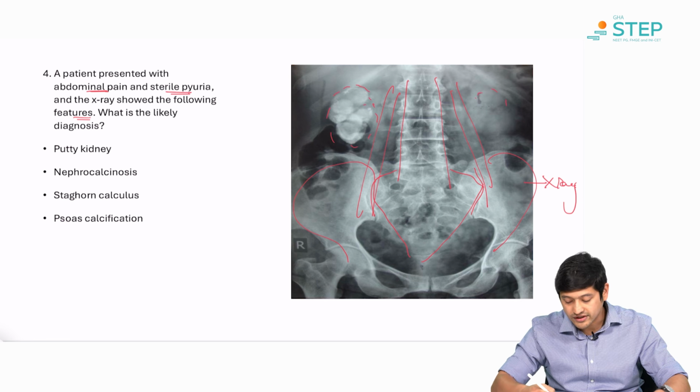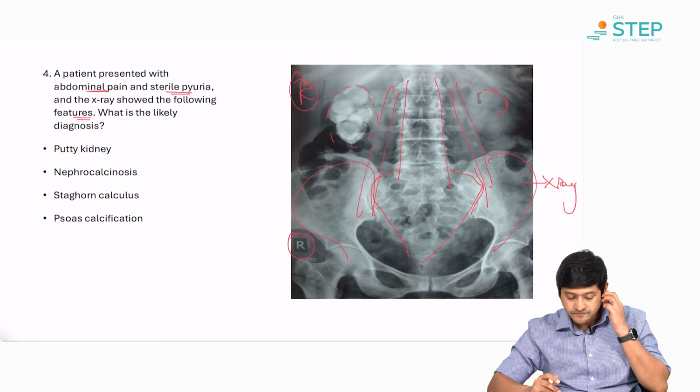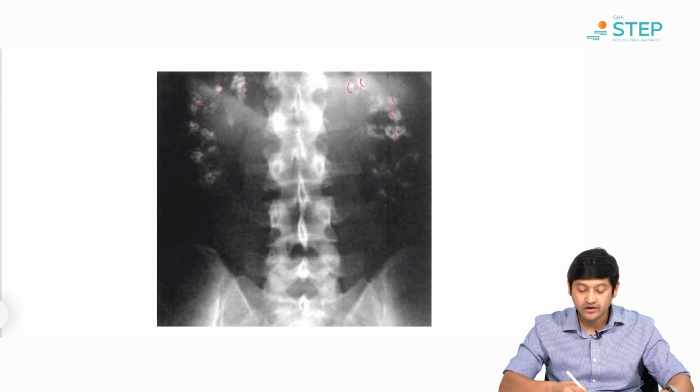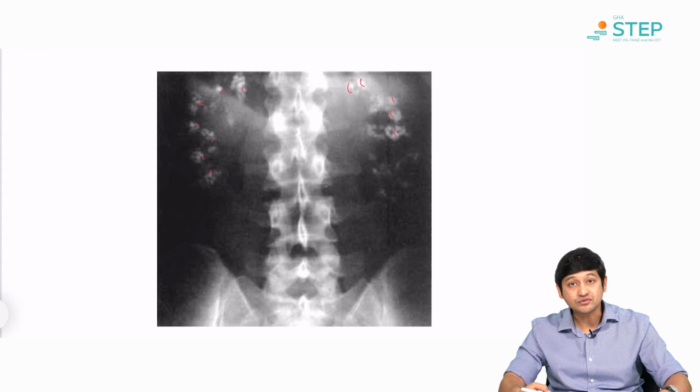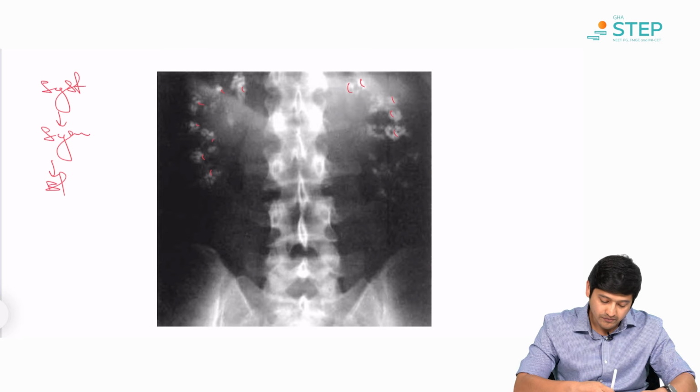It is not seen on the opposite side. You don't see it on the left, you only see this on the right as the marker would indicate. When you have a radiograph which is showing you opacities on both sides, you are very often looking at some sort of systemic issue that has become symmetrical and bilateral. So if you have a systemic problem, you are most likely to have a symmetric pathology which is bilateral.